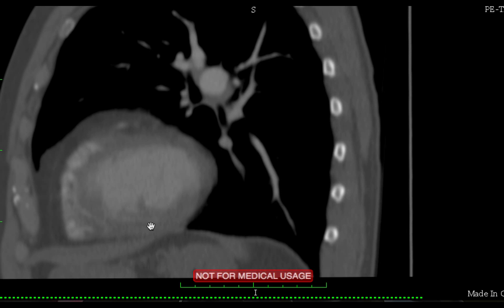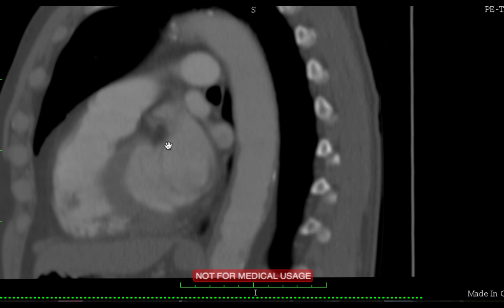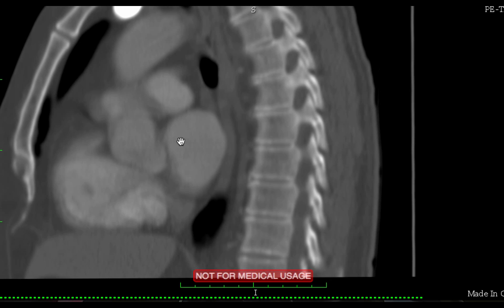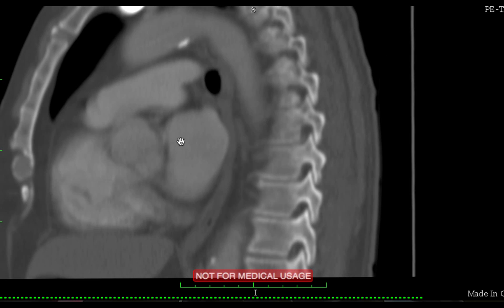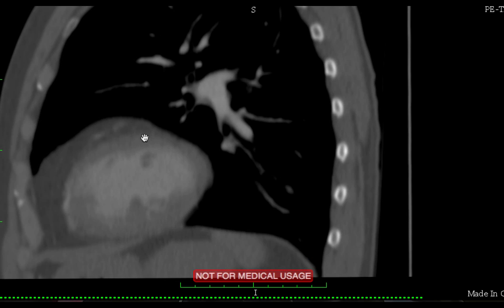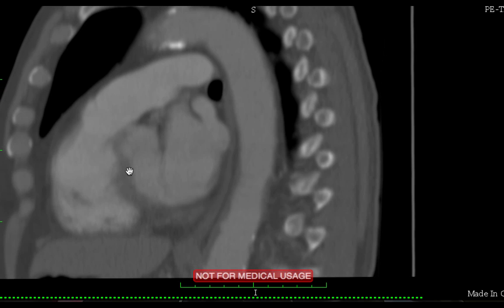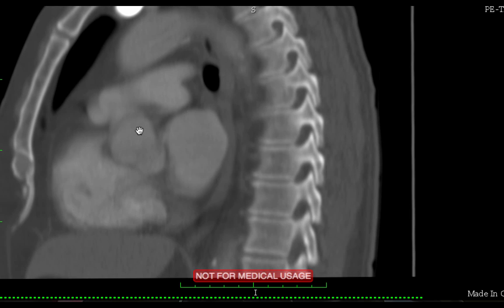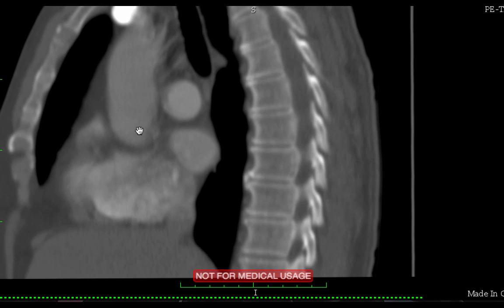This is the left ventricle, thick myocardium, and then it gives rise to the aortic outflow tract, you could say. Here. It's here, not there. So here's the left ventricle, and this is the left ventricular outflow tract, and it becomes the aorta.